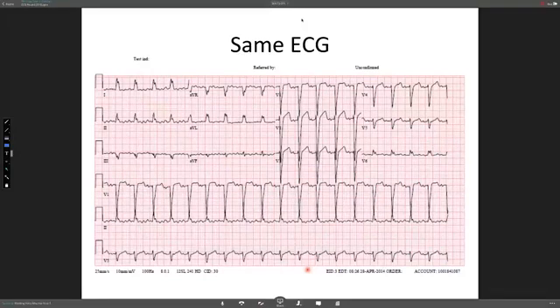Right. Very valid point. Very interesting, because the bigger the muscle involved in the artifact, at least in my experience, the bigger the waves you see, and then instead of an AFib artifact, it becomes a VT or VF artifact and gets more scary. And I'm sure all of you have seen those before. So very interesting, Khalid. I like it.